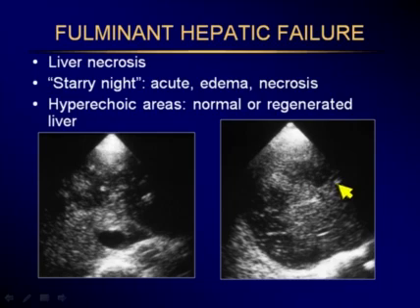Another patient that I recall with this pattern was a 34-year-old woman who was weak, a little bit jaundiced, also in the outpatient setting, and I thought, gee, something's very wrong with this liver. I sent her to the emergency room, and on follow-up I found out that within 24 hours she was dead. Autopsy revealed that she went into heart failure. She had lupus myocarditis and lupus hepatitis and developed this acute fulminant failure. So these are unusual cases, nonetheless serious, and we should not dismiss such an appearance.